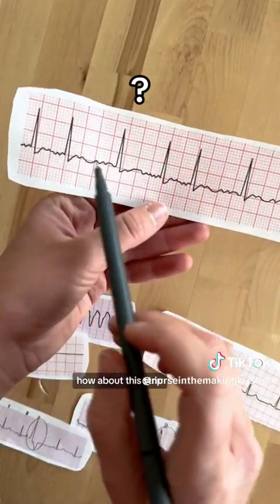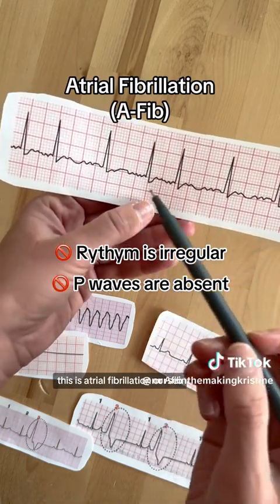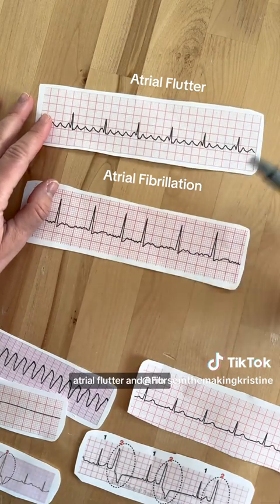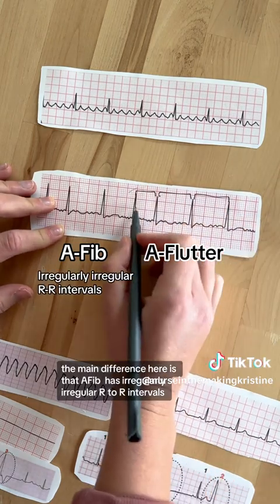How about this strip? The rhythm is irregular and the P waves are absent. This is atrial fibrillation or AFib. A lot of students get these two mixed up, so I'm going to tell you how you can notice the difference between atrial flutter and AFib. The main difference here is that AFib has irregular R to R intervals.